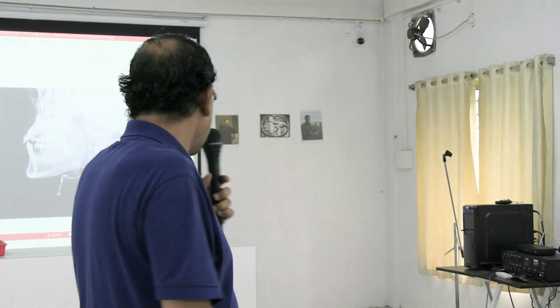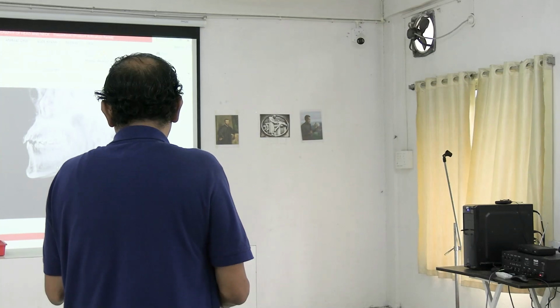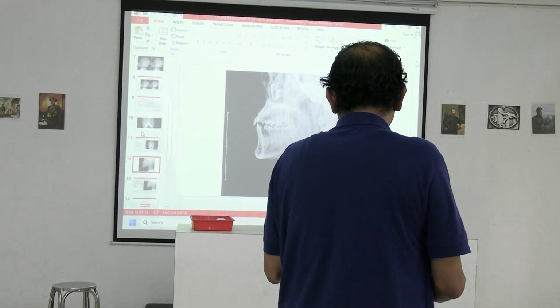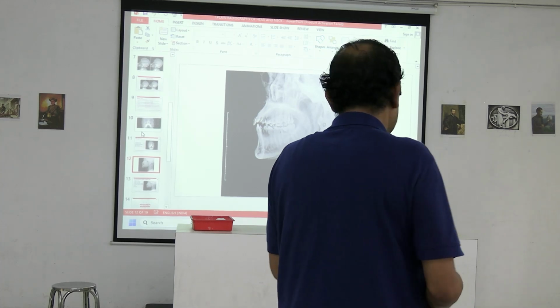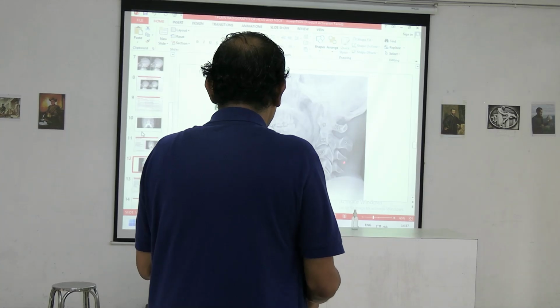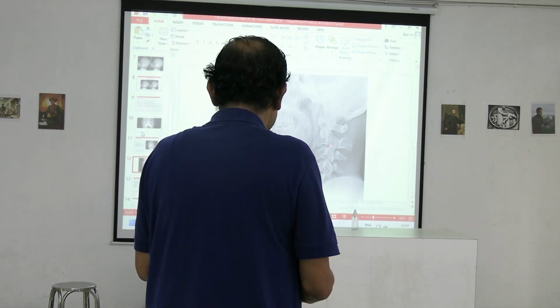And also we can see this cervical vertebra, which is projected in front. These parts are projected in front. Sometimes we can get the bony spurs. That is also a pathological one. These are the spines. Transverse process we can see, and we can get the intervertebral foramina.